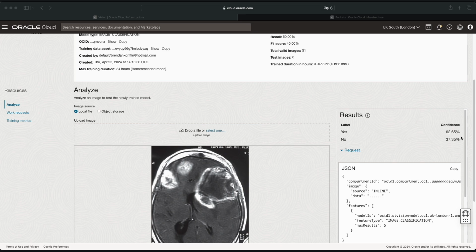So you've seen the demonstration today. Hopefully it's got you excited about using the OCI Vision AI service. I've shown you that creating custom models is not really that complex at all. And the real good thing about this, there's a really good rich API. So in order to use the model, you can quite rapidly build web applications and other applications that integrate with the model to test and validate any images that you want to throw at it.